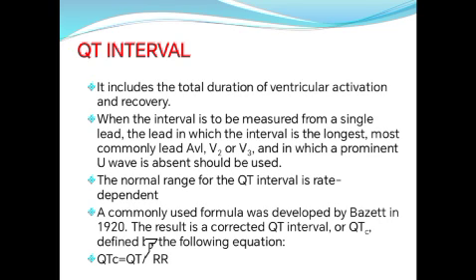It includes the total duration of ventricular activation and recovery. Yes, it represents both ventricular activation and recovery. We can measure it, as I said, in AVL, V2 or V3, because here we have no prominent U wave.